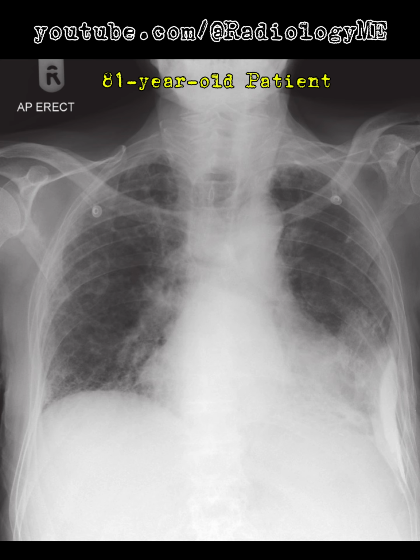This kind of pattern is very consistent with pulmonary asbestosis. Now, as I keep reviewing the image, I'm also seeing increased interstitial markings bilaterally, particularly in the lung bases. This really aligns with a fibrotic lung disease with a basal predominance. Given these findings, I'd say pulmonary asbestosis is my top differential here, especially if we have a patient with a history of occupational exposure, think something like shipbuilding or construction.